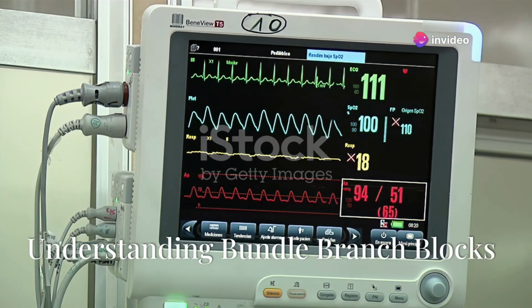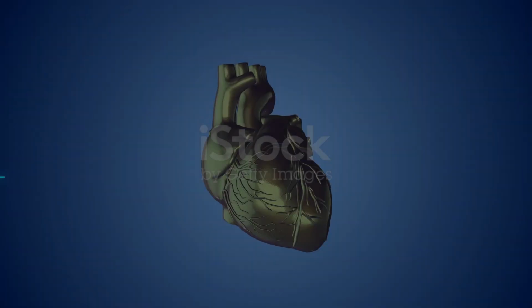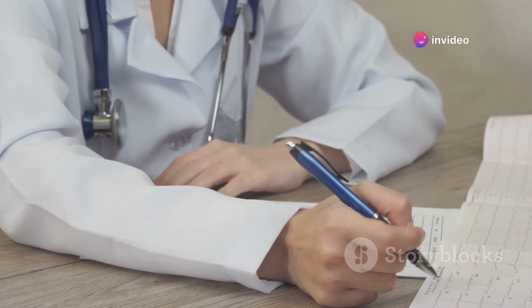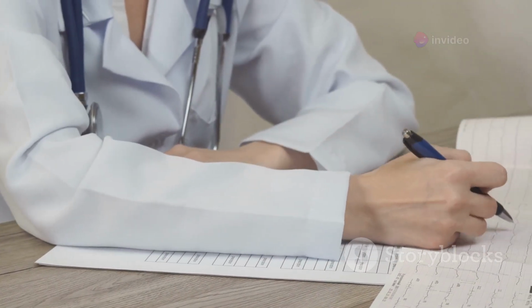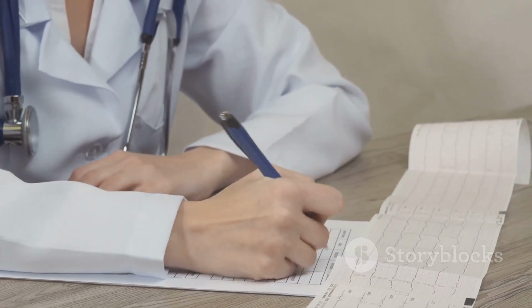Blocked signals. Understanding bundle branch blocks. The electrical signals that control your heartbeat travel through specialized pathways within the heart. When these pathways are blocked or delayed, the heart's rhythm can be disrupted. One such disruption is known as a bundle branch block, which occurs when the electrical signal is slowed or completely blocked as it travels down the bundle branches.